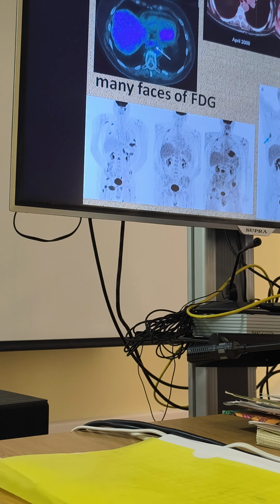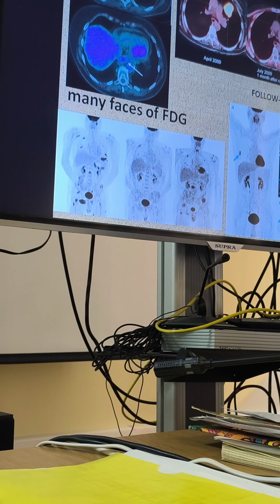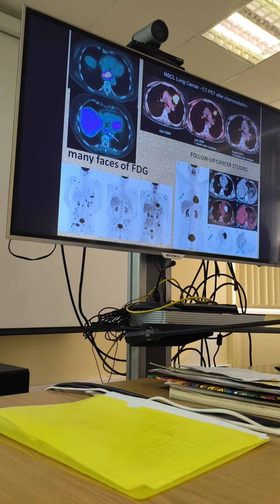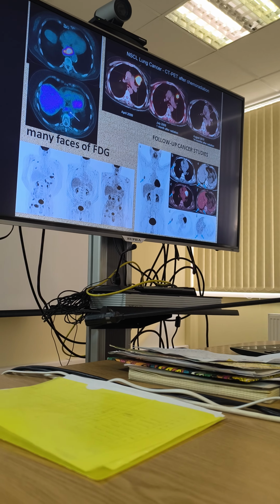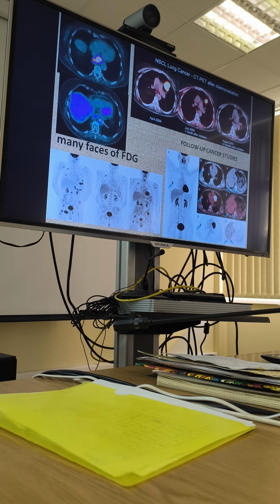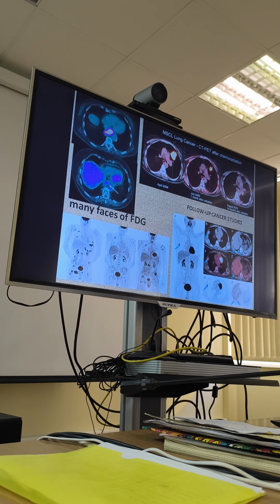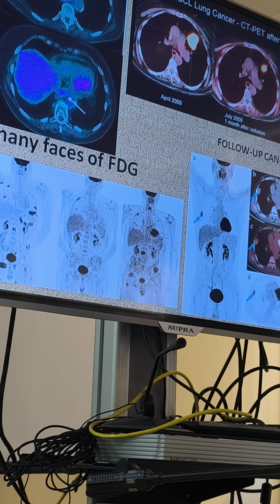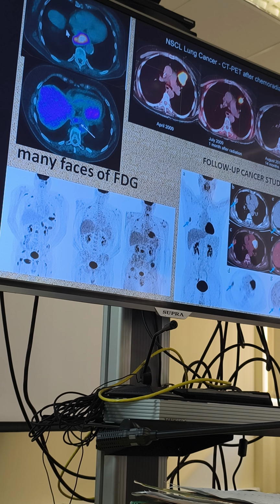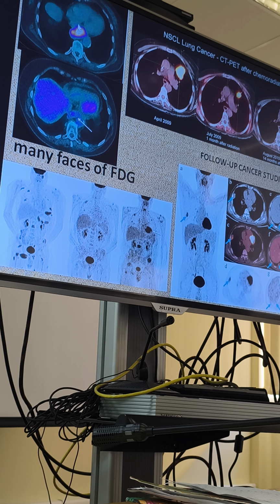Well, to continue, let's see that there is another useful thing for FDG in tumors. These are follow-up studies. And this can be studies which we are performing in following up treatment. So, for example, this is esophagus cancer, and it's avid to FDG in high degree.